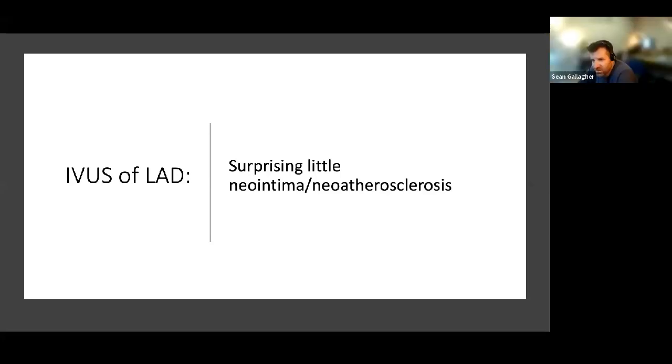So if you can't guess, should you measure? Well, that's it, isn't it? This is why you should always use IVUS in the proximal LAD. And this is why co-registration is lovely, because actually it's quite difficult to size graded balloons for that segment from the first septal down to the second diagonal, because you might need 2 or 3 different sizes if you really want to get good smoothed apposition.